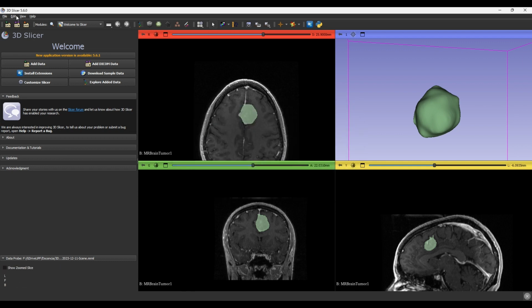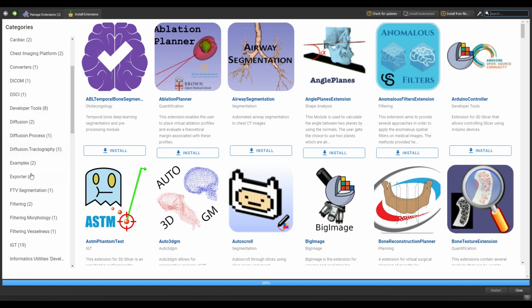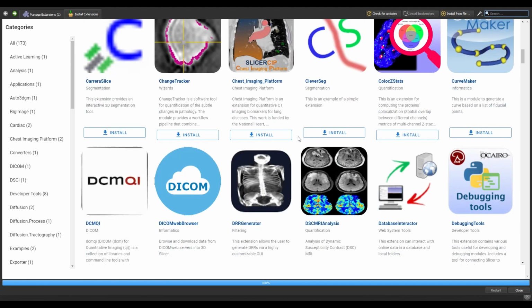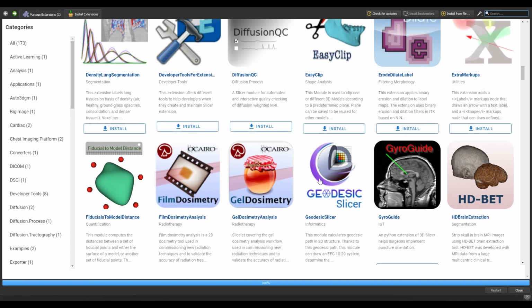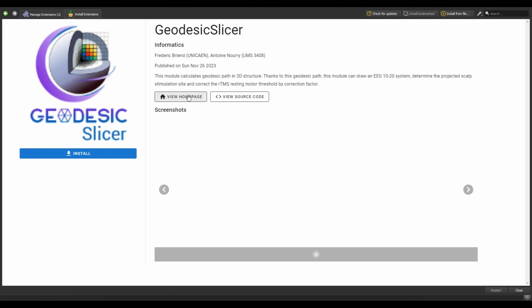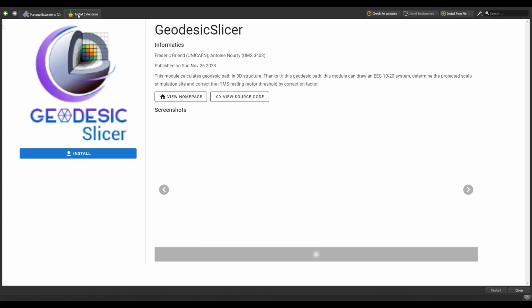Extensions can be installed from the Extension Manager and the View menu. The Install Extensions window shows all extensions and allows you to download and install them. On the left side there is a list of categories. Please, take your time to navigate and discover different extensions. Selecting an extension provides detailed information. I suggest you install some of them and dedicate some time to play with them.